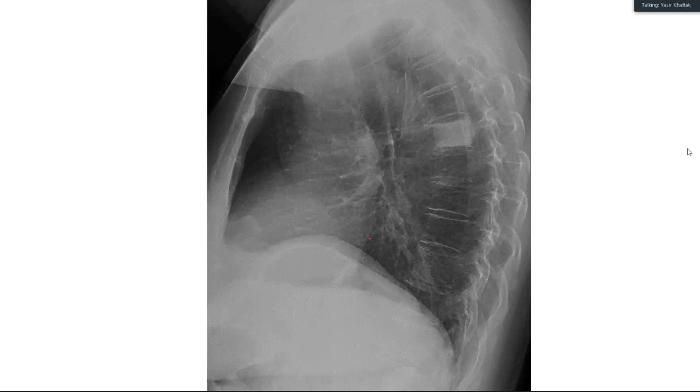If there are some findings which point to a different diagnosis, then you can mention, I would like to add some other additional findings which I see, which can change my differential diagnosis, and then the examiner can respond. So do you have anything else which changes your diagnosis from hemangioma to something else?